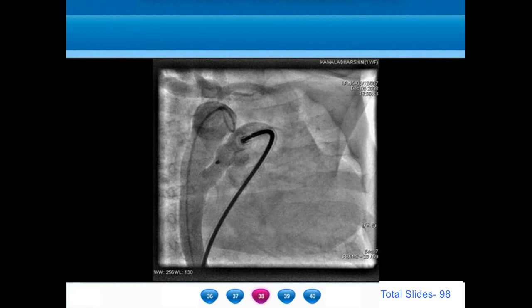Yet another cause of an abnormal PDA course on echocardiography: a patient with a right descending thoracic aorta, the long tubular ductus arising from the mid-thoracic aorta and ascending up in the mediastinum and getting inserted in the pulmonary artery bifurcation. Once again, these ductus will not be visualized along its entire length and width in the standard ductal views and the standard suprasternal views.